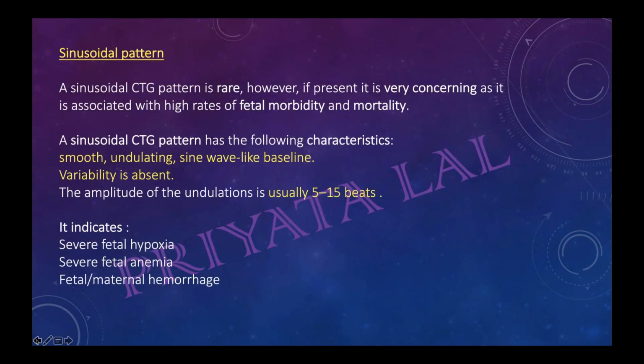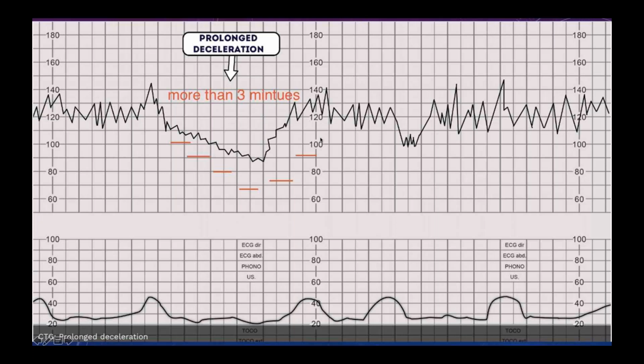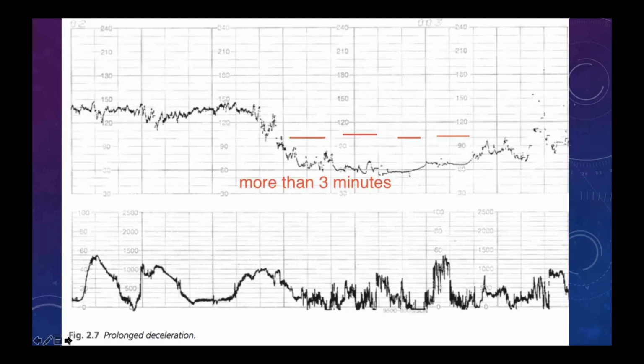Okay, so for Part 3 people, this is a very common trace they usually give. In their station, they will give you this kind of trace, and also one scenario. They want you to explain this to the role player, and also explain to her about expedition of delivery. So this kind of trace is very common for the Part 3 exam station.